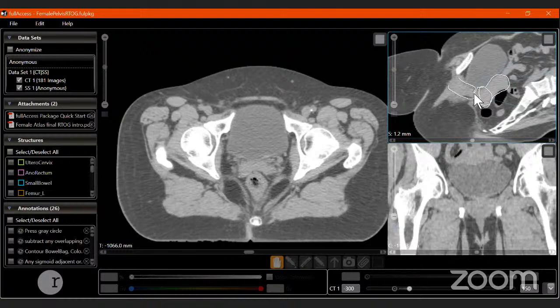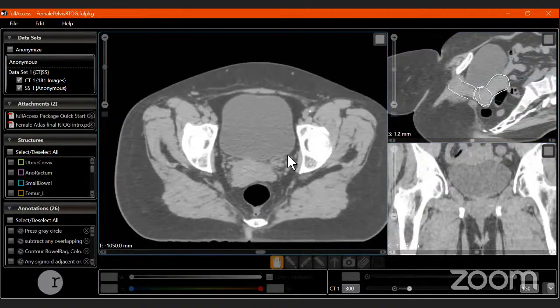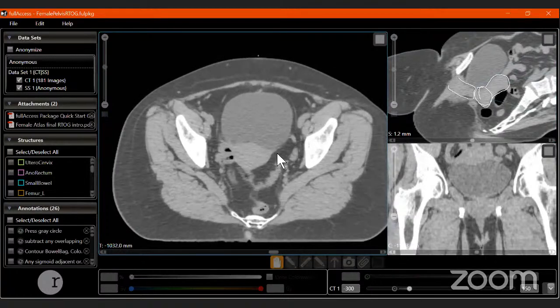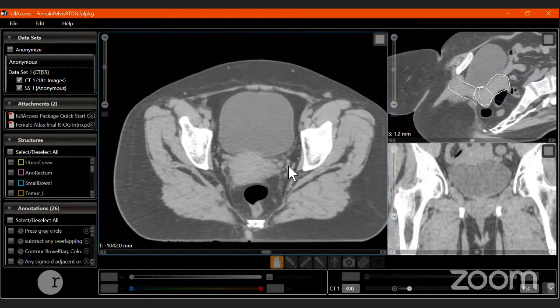In such scenarios, identifying this becomes a bit difficult, but since we are going to include the paravaginal tissue and the parametrial tissue in most of the volumes, we can start the contours right from the adnexal region. So find the adnexa. This is the adnexa. As we go down, start contouring from here, from the edge of the uterus up to the lateral pelvic wall, which is the muscle. There is no muscle here, so obviously from here to here entirely. I would contour this entire region as the parametrium region. Fine. And then we keep coming down.